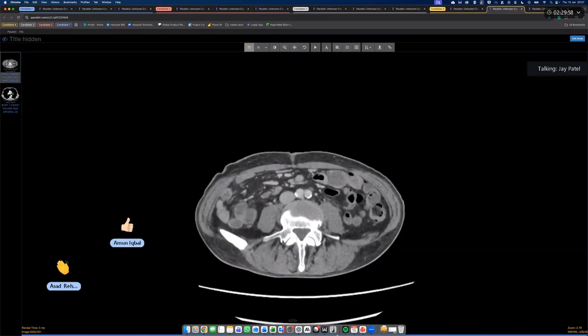Strong differential. You said carcinoid, you said metastasis, you said GIST. What type of metastasis might you see that would cause this type of appearance? I think melanoma mets. Exceptional. Stop. Melanoma. Bloody brilliant. Really well done. I fully agree. A melanoma metastasis would look something similar to that.